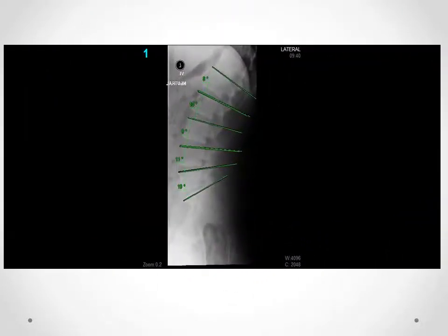So here on the same lateral lumbar radiograph, I measured the lumbar lordosis. It was 60 degrees. I've now measured the intersegmental angles by drawing a line first from the superior end plate of L1 to the superior end plate of L2. That angle measures -8 degrees.